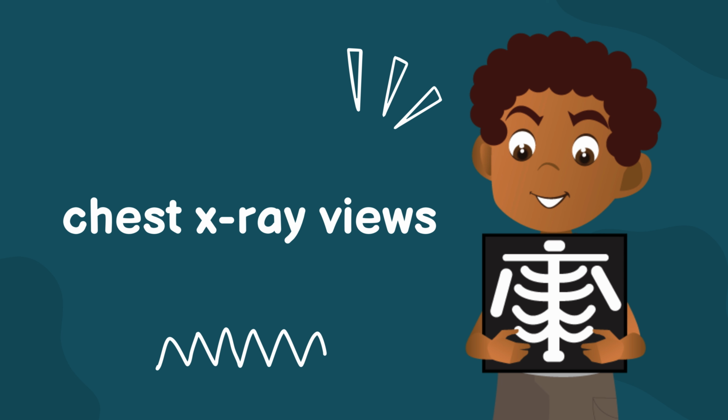We'll cover standard views like the PA, posteranterior, and lateral, as well as specialized views such as the oblique, decubitus, and lordotic positions. Each view has its specific use, helping clinicians assess various conditions such as lung diseases, pleural effusions, pneumothorax, and more. Let's dive in and take a closer look at how each view helps provide a clearer picture of the chest anatomy and potential pathologies.